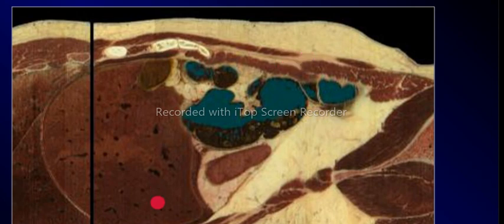So in this image, these are muscles of the back. This is the lateral edge of the right kidney. Here you have the ascending colon on the liver, and a bit of the gallbladder peeping. Then the yellow here is mesenteric fat. These are muscles of the anterior abdominal wall, and this is subcutaneous fat, then skin on the other side.